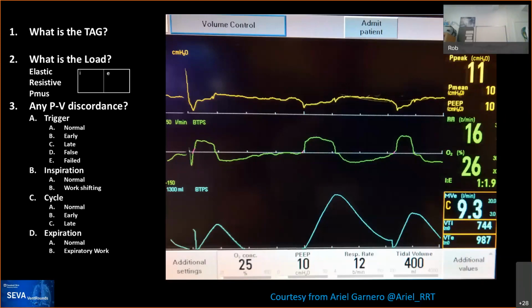Okay, I'm going to give this one to you. I know you can read this one. We're almost there with the time. Keep going at your leisure. We have 30 seconds more. Five seconds.